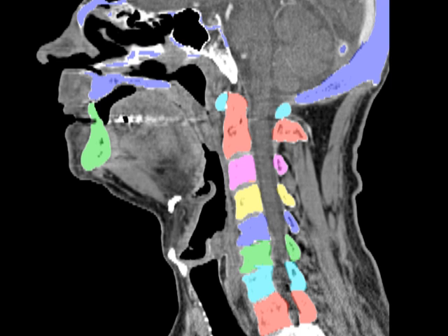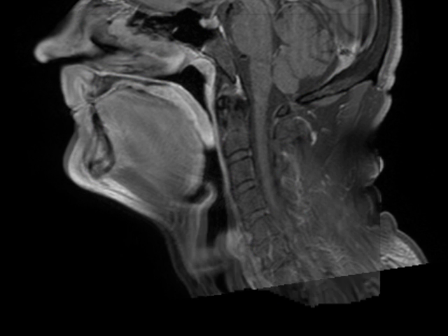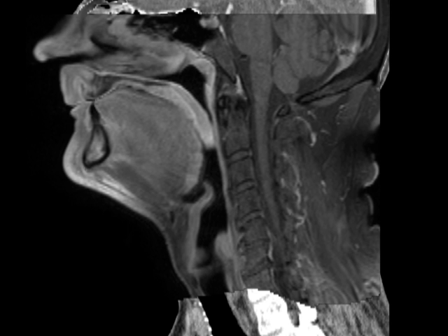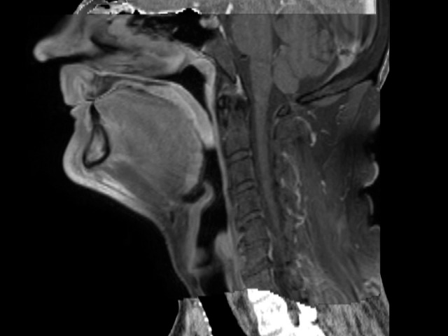First, all bony structures, such as the skull, the jaw, and the single vertebrae, are segmented individually. Those structures are then rigidly aligned to the MR image piece by piece. The transforms for the surrounding soft tissue are then determined by extrapolation. Due to incorporating prior knowledge about human physiology, the capture radius is increased compared to other deformable registration methods.